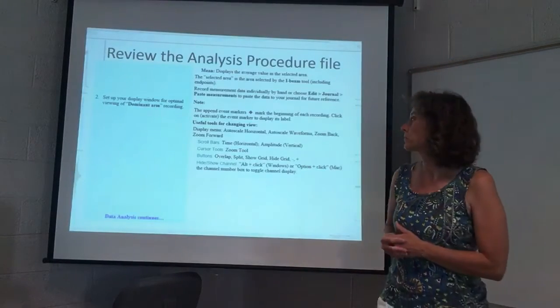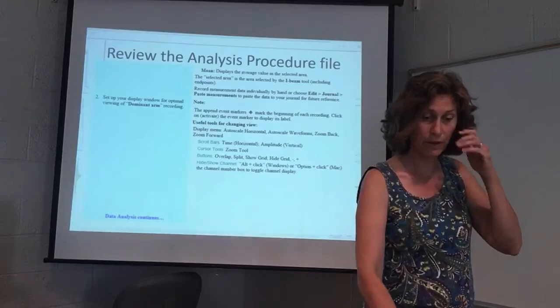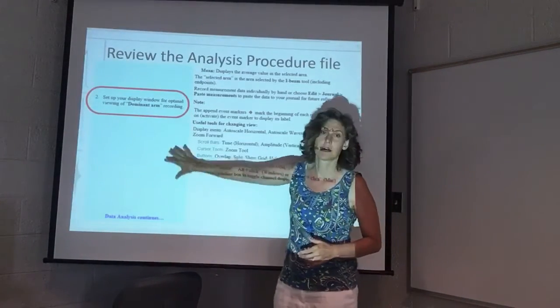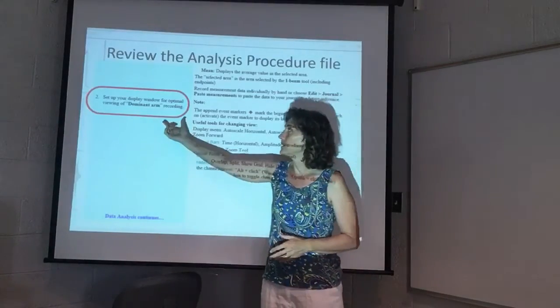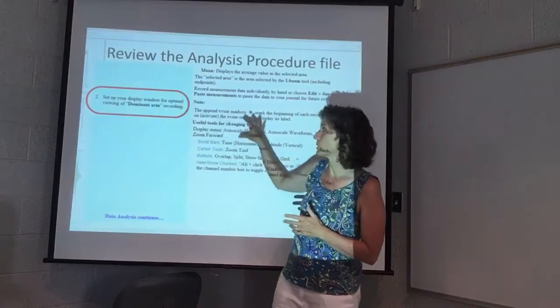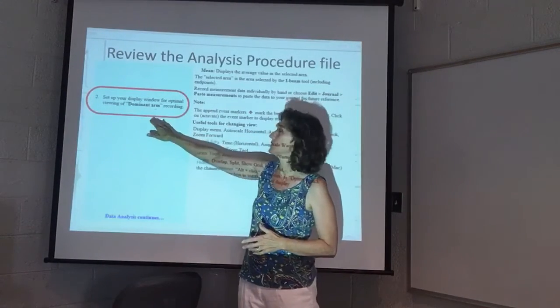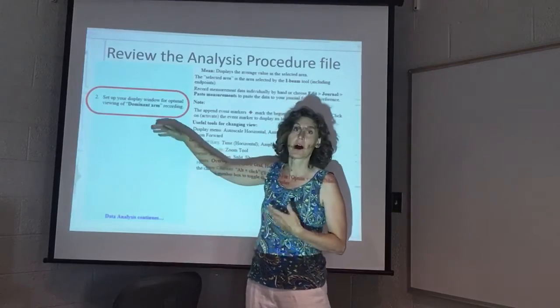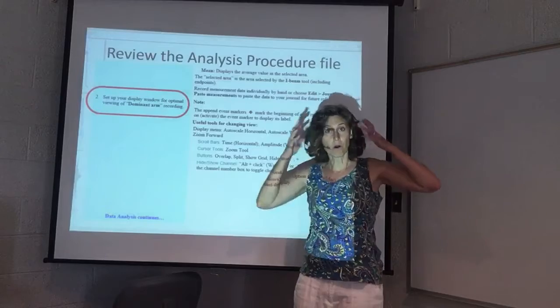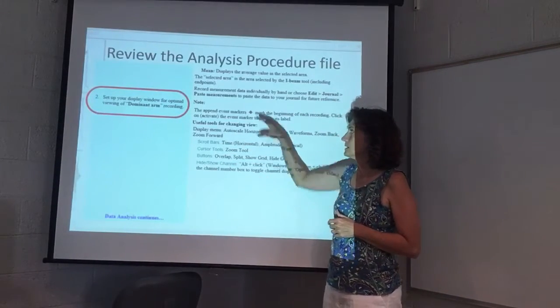So as you scroll down on that analysis procedure file, what you'll notice is in this turquoise colored sidebar is a little bit of an anchor point to tell you here's what all this stuff is about. So what you're going to do is set up your display window for optimal viewing of the dominant arm recording.